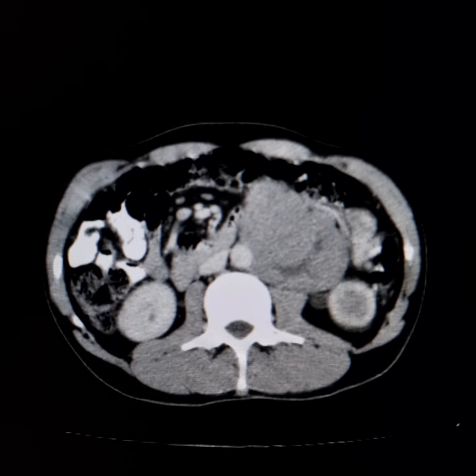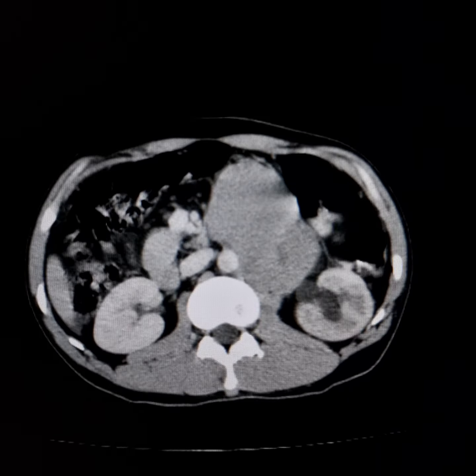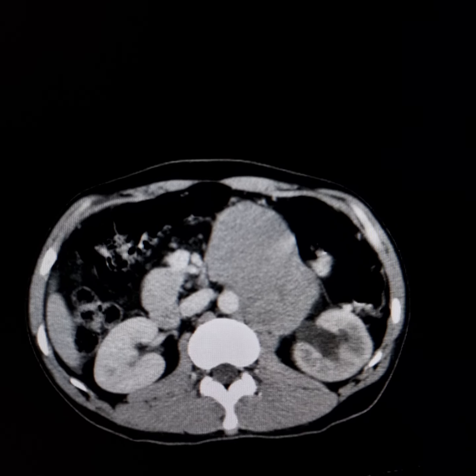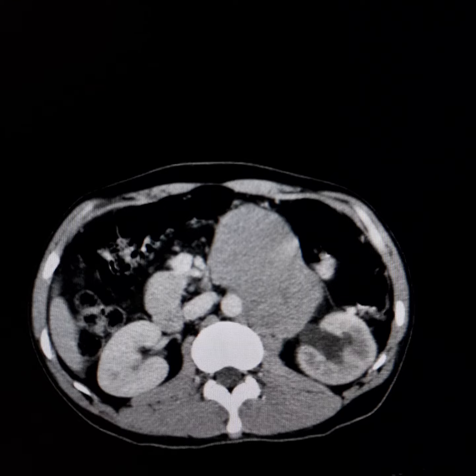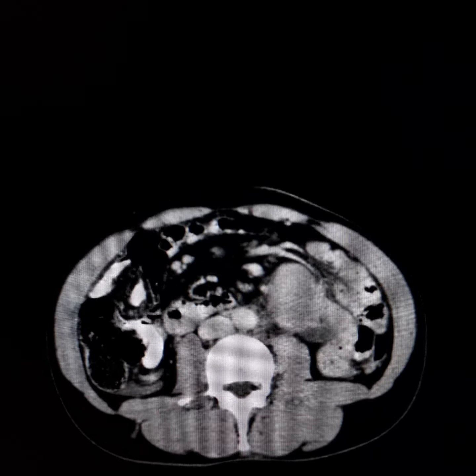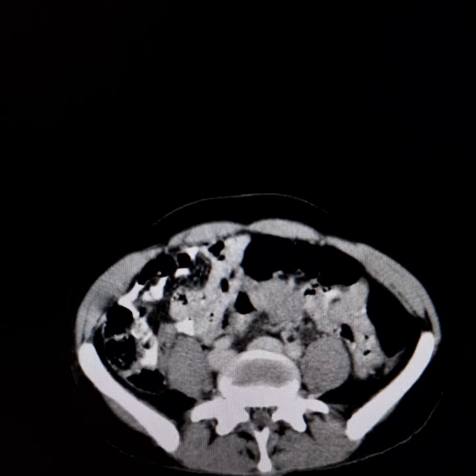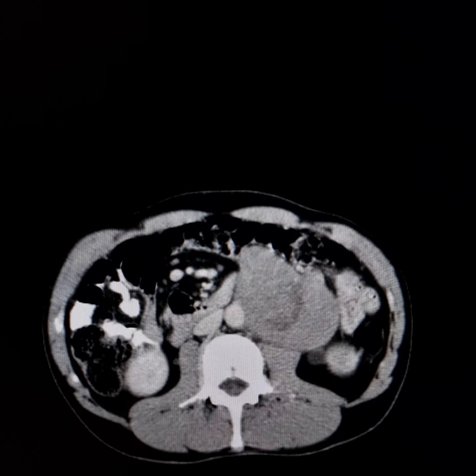So one important thing is that in any CT scan where such findings are present, the likely differentials in such cases, if there was no history of undescended left testis, the possibility could have been a lymphoma, and if there is a history of undescended left testis, then obviously nothing else but seminoma of the undescended or intraabdominal left testis and its metastatic deposit in the left paraaortic region.